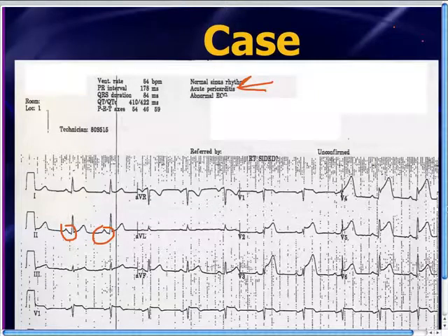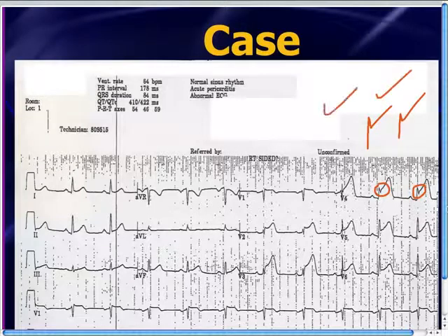But again, if you look in that lead V4, take a look at what's happening out here. You've got the R wave that goes up, and then without much of an S wave at all, bang, it suddenly shoots out into the T wave. It's like the S wave is gone. The QRS complex got smushed right up against the T wave, so there is no ST segment, okay? You notice that up there also. The R wave's coming down and then suddenly shoots out. It's almost like a check mark, all right? Something I refer to as the checkmark sign or the QRT sign. Okay, and let me give you one more example. This, by the way, turned out to be a true STEMI despite what the computer said.